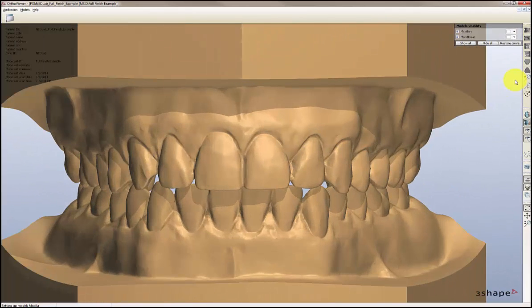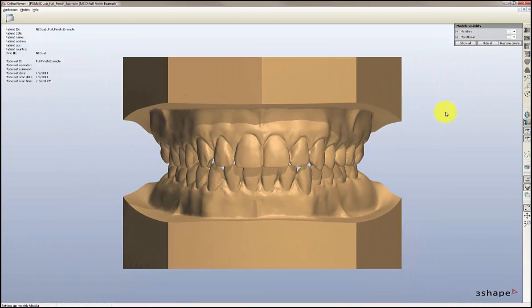As you scroll down, you'll notice that there's a zoom all. When you click on that, it zooms all the way out on your model set. This is your one-to-one zoom. If you go down to one more, it's the Axis Locked Rotation icon. Left click on that and you have 4 axes that you can rotate your model set on. Free rotation, the X, Y, and Z.